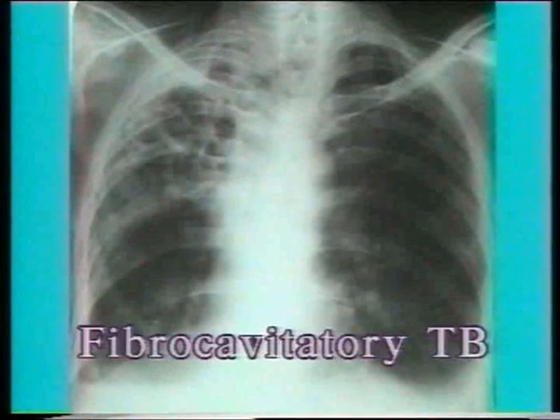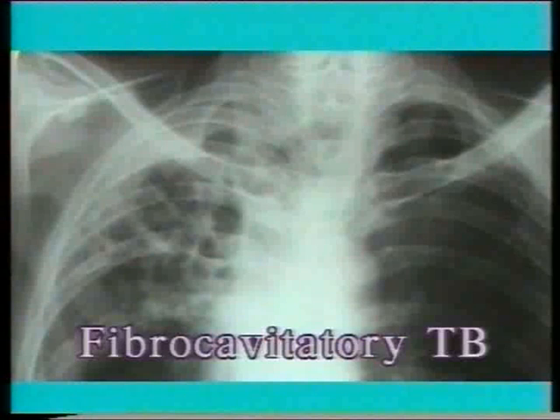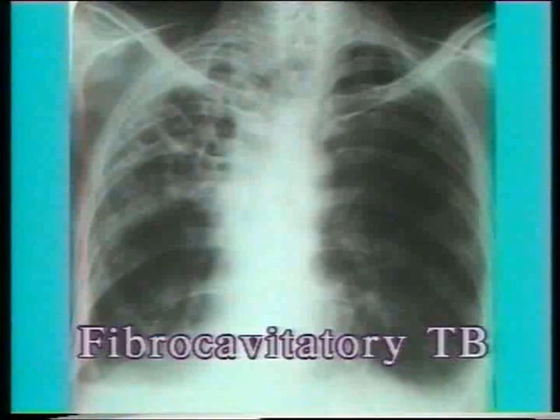This is an X-ray of fibrocavitatory lesion on the right side with compensatory emphysema on the left. Note the multiple cavities and fibrosis in the right upper zone with trachea pulled towards the lesion due to fibrosis, while the opposite lung is hypertranslucent due to compensatory emphysema.